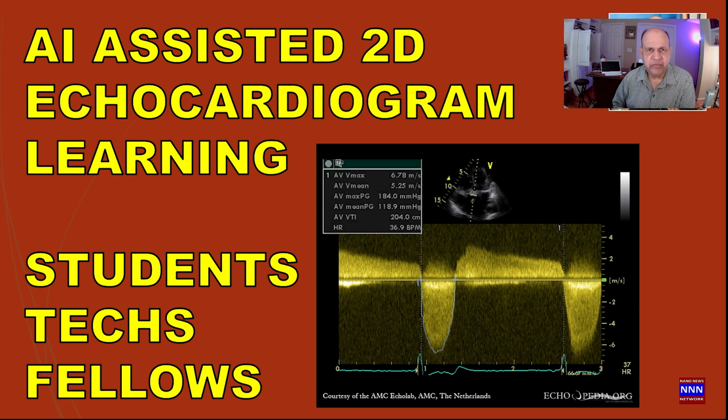In this presentation, we're going to look at AI-assisted 2D echocardiogram learning, interpretation, and analysis. This is good for whoever wants to get more information and diversified findings and inferences, so that you can look at it from a different perspective than what you're thinking about yourself.